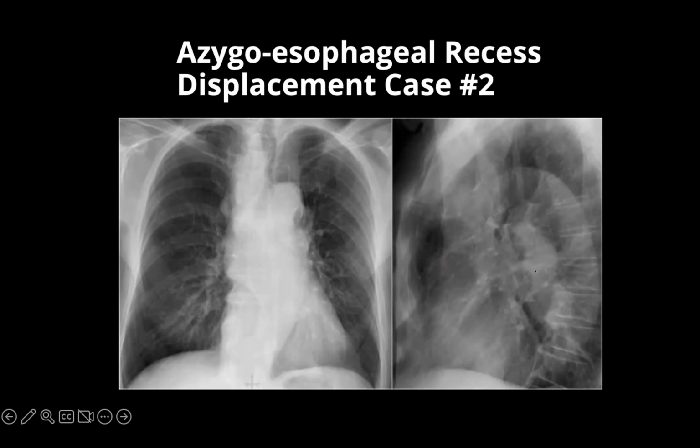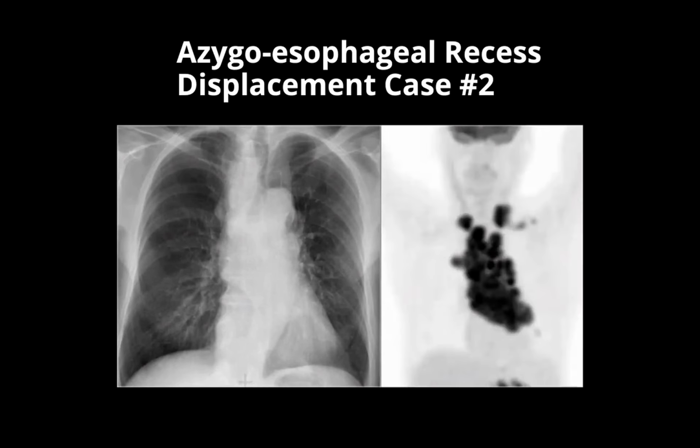And if you have a lateral view, always look at it. You can see that there is a lumpy, bumpy density at and around the level of the hilum. So with all of that involvement, multiple locations, multiple compartments, you're thinking of the very strong possibility of enlarged lymph nodes, as it is in this case.